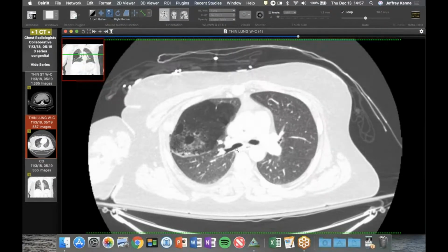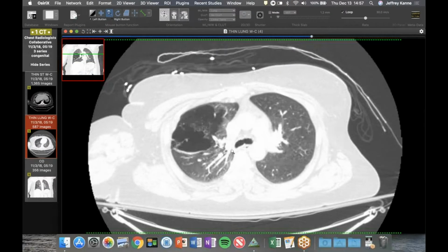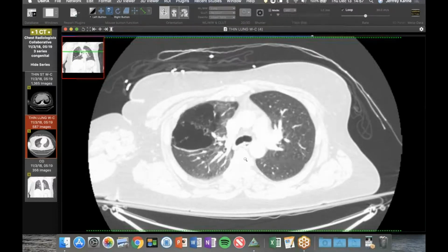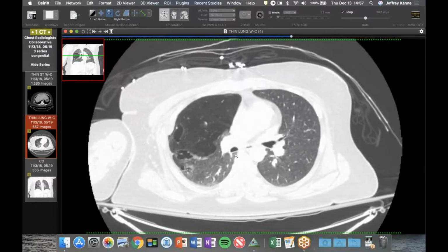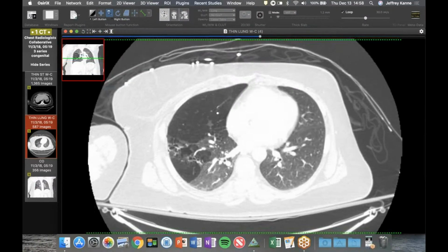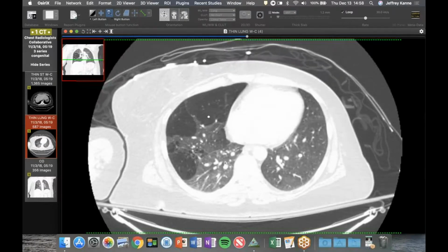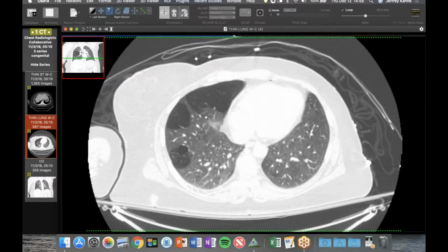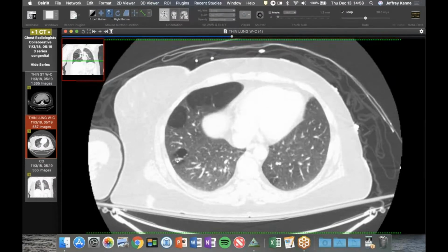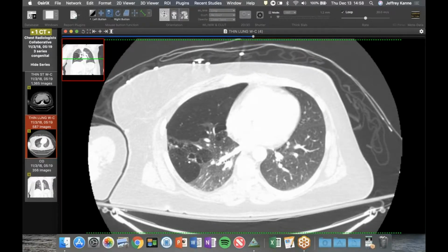And then if we follow the airways, here we are at the right upper lobe bronchus. It looks like everything that's supposed to be there is there, but this doesn't really hook up to anything. So I think this is a CPAM with bronchial atresia in it, and probably some congenital lobar overinflation or hyperinflation, sort of all combined together. It seems to be middle and upper lobe, but in that, probably a little bronchocele throughout it. So this is just a big one.